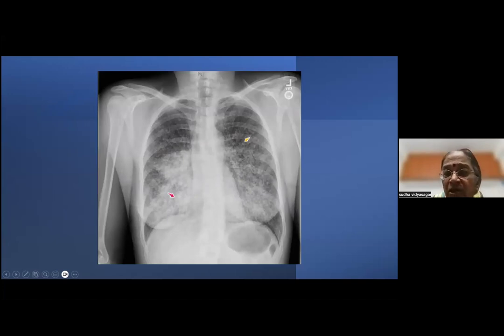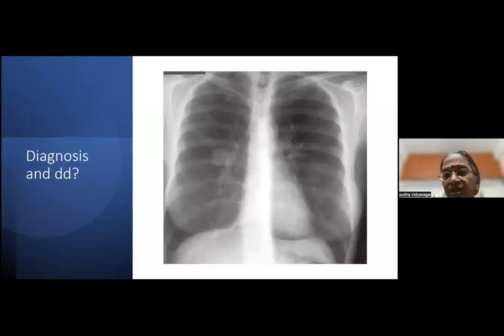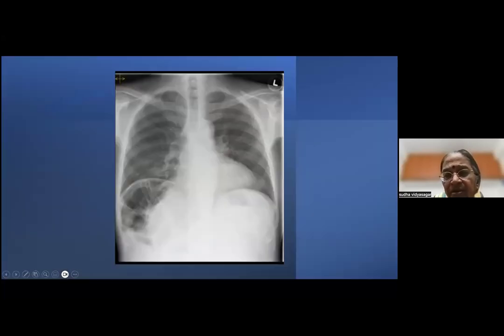Again, miliary is not only tuberculosis, there are multiple causes of miliary mottling. One more bronchogenic carcinoma, one more small, probably some amount of lung abscess could be there. That's one single solitary pulmonary nodule that you can see there. Okay, that should probably be the last. What is that? We'll end with this.